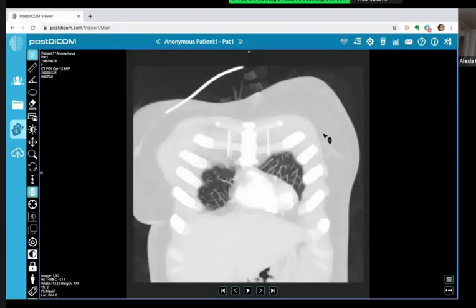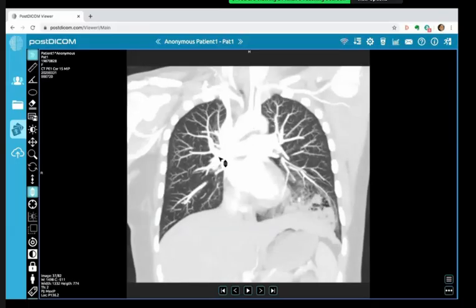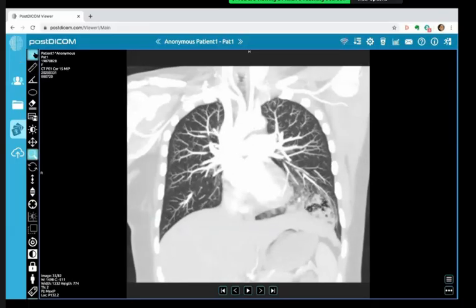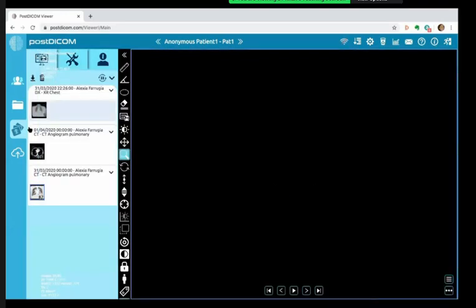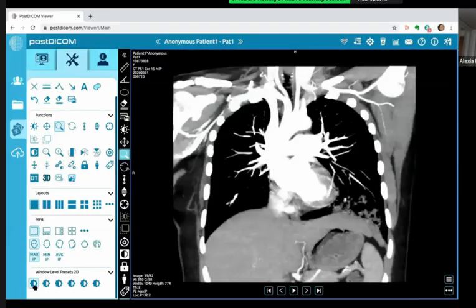I'll show you a MIP image. And I wasn't confident that I could see its own pleura. It didn't seem to be clearly encapsulated in its own pleura. No. So it's an extralobar sequestration. Intralobar, sorry, yeah.